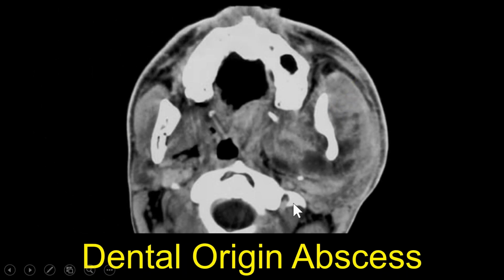Here's another case. This is more impressive. We have an axial post-contrasted image. So on the contralateral side on the right, we see the very dark fat. This is the parapharyngeal fat. It's fat next to the pharynx, so it's parapharyngeal fat. There should just be fat at that location, but it's very important because we see how it's displaced when we think about pathology here. So on this image, we see enlargement of all the muscles on the left side, and we see fluid with surrounding enhancement.